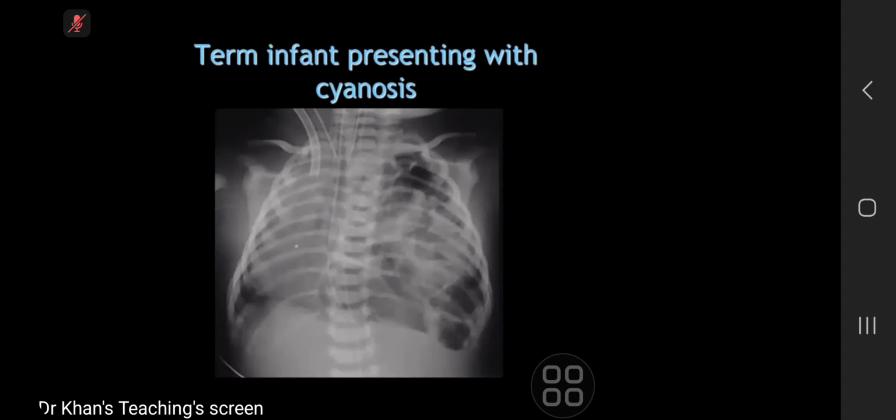The striking abnormality is gas-filled, what appear to be bowel loops within the left hemithorax, causing rightwards mediastinal shift and extensive compression of the normal thoracic structures. And the appearances are consistent with a large congenital diaphragmatic hernia.